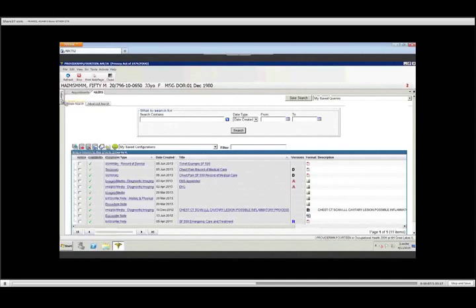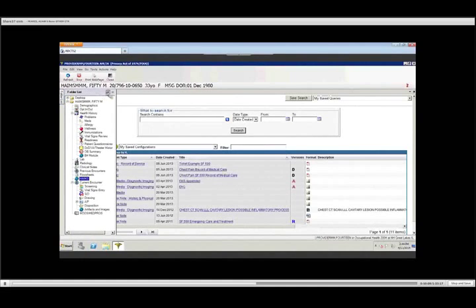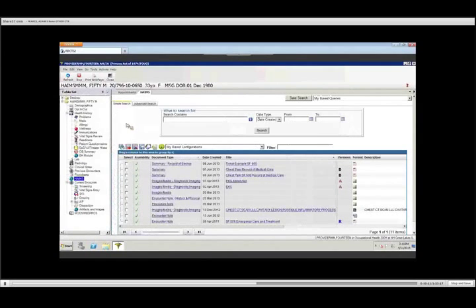So now that we've imported documents into the HAIMS application, there's a really cool feature that allows the user to take that asset and associate it, or paperclip it, to an encounter. I could paperclip it to a current encounter, I could paperclip it to a previous encounter, or I could even paperclip it to a problem if I choose to.